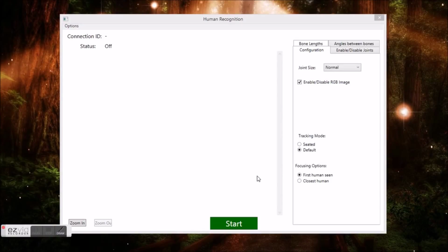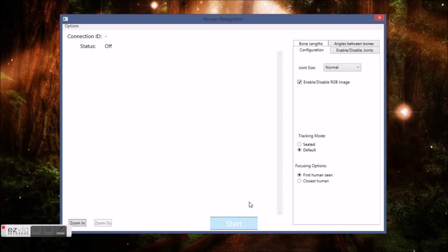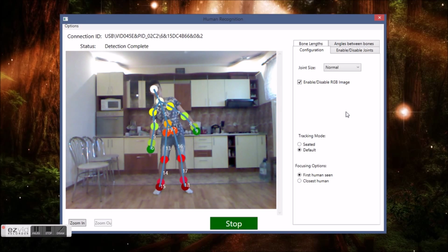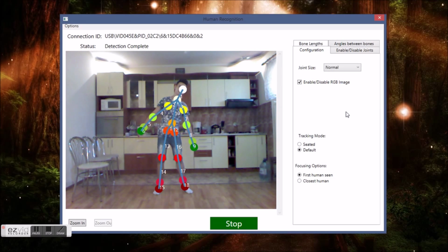The correct posture detection application is built with two essential components, the configurator and the user interfaces. The configurator interface, what we see right now, is designed for the doctor or the recuperation exercises trainer to specify how the correct posture looks like. All the configuration process is made in a tab control item placed in the right of the screen. This tab controller has all its features grouped in categories.